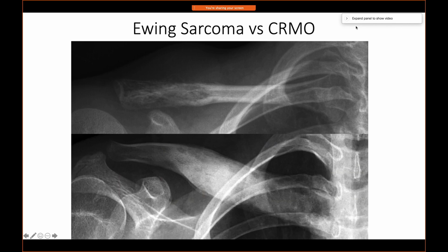Or maybe this is a cat scratch. I have to go look at that. Any comments from the rest of the gang here? I've got a case I'll show next time, Mahesh. Okay.